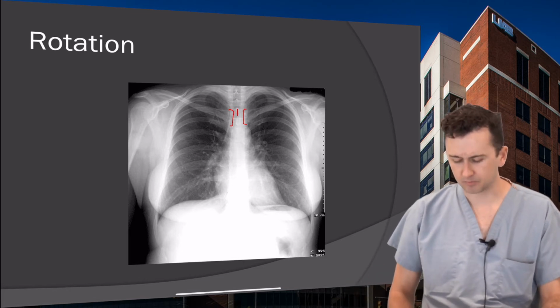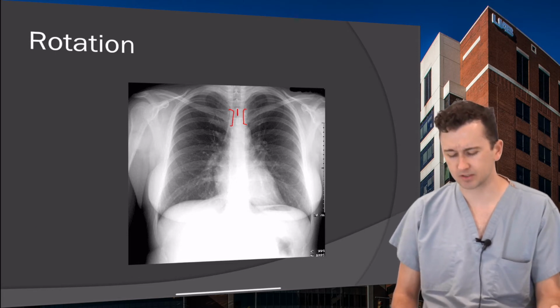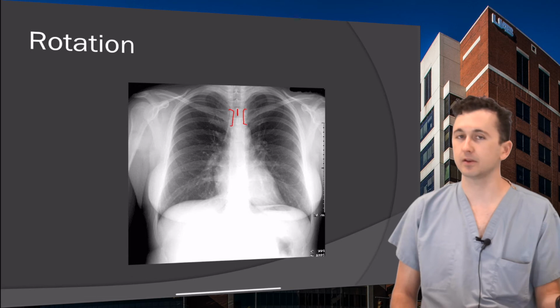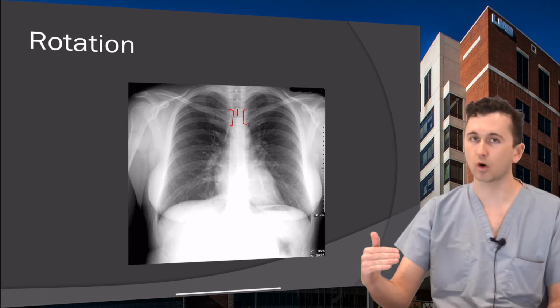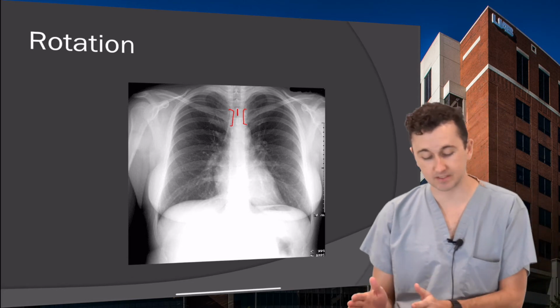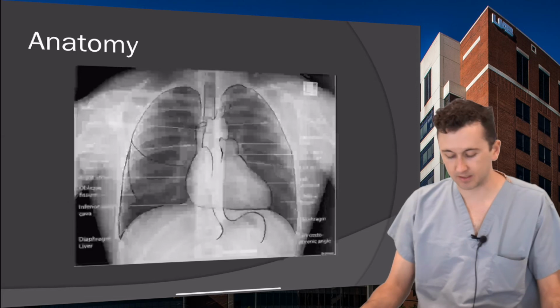Okay, so when it comes to the penetration and the inspiration and the rotation, this will be something that you do really quickly. As soon as you look at a film, you're going to be able to tell is the technical quality where I want it. And once you've assessed that, you move on to the next part. So let's briefly look at our anatomy.